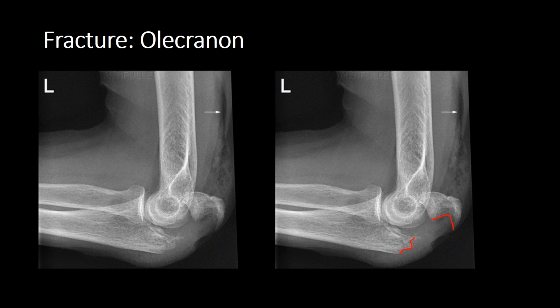But now we can clearly see the subcutaneous emphysema, i.e. the air that has now been caught up within the soft tissues. And this subcutaneous emphysema is very important because it means that this fracture is an open injury, and therefore there's a high risk of infection getting in.